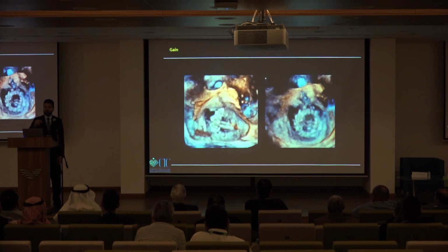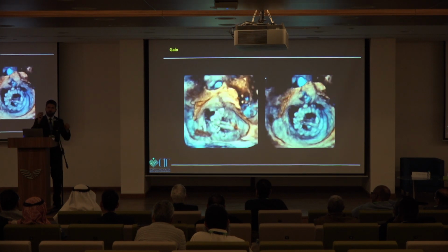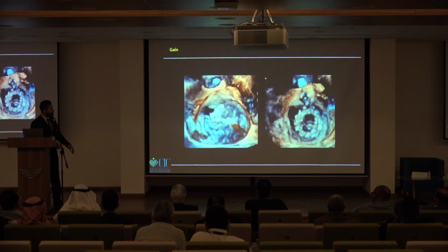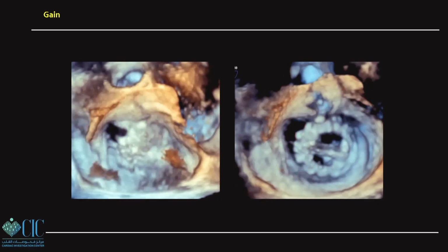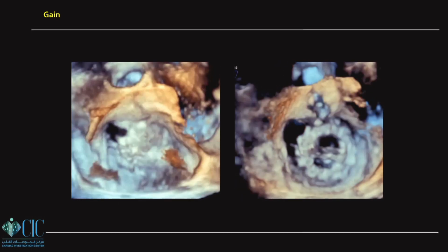So what to do? Just decrease the blood signal, this brown signal, a little bit till you can see the valve and stop there. Don't over reduce the gain. Otherwise, you will oversize the defect. And sizing shouldn't be done on the 3D image itself, because now with the new machines, we can freeze and do tracing, right? We can do this, but this is not advised.